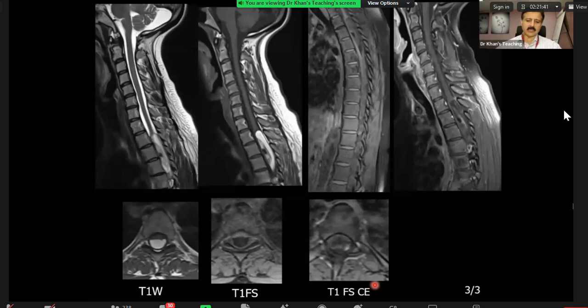So this is another dermoid. Interestingly, we got a secondary opinion from a tertiary neuroradiologist on this case, and some of the gurus think that because there is a bit of enhancement, it might be a teratoma.